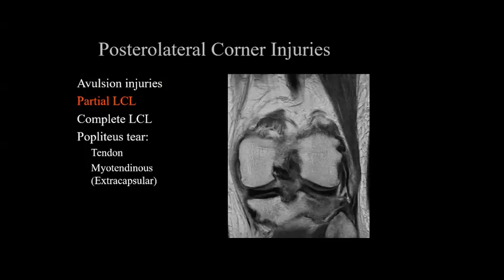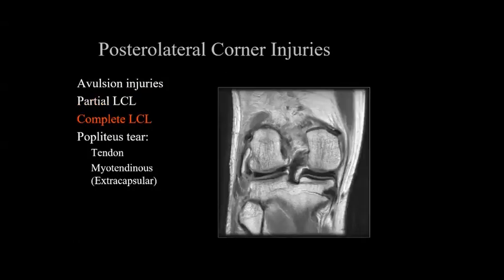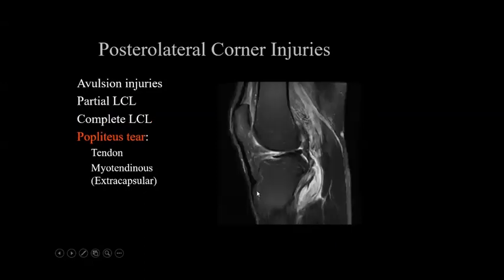And here we see a tear of the fibular insertion of the lateral collateral ligament. There's discontinuity here at the fibular insertion of the lateral collateral ligament. And also here we see disruption of the fibular attachment of the lateral collateral ligament.